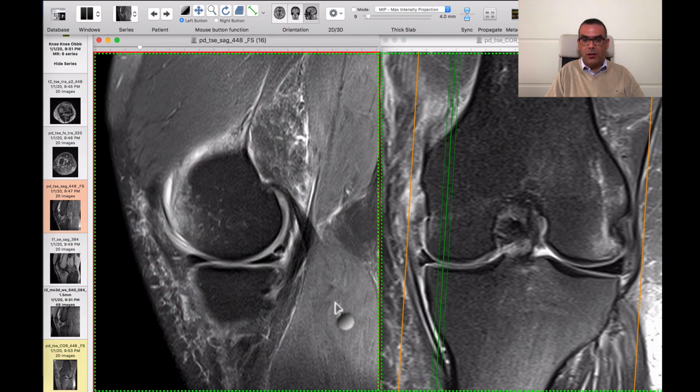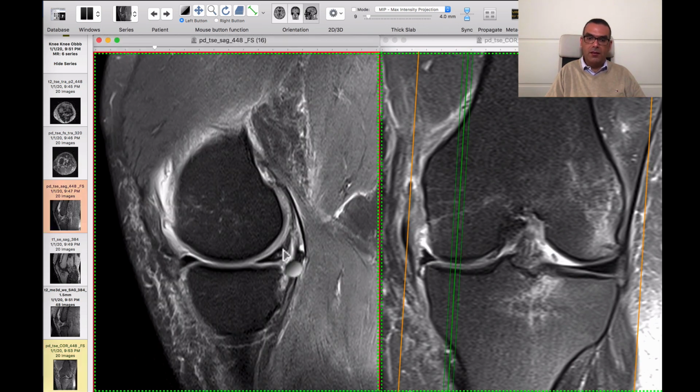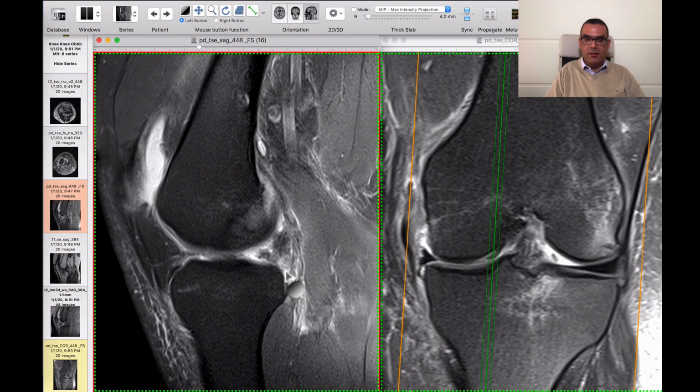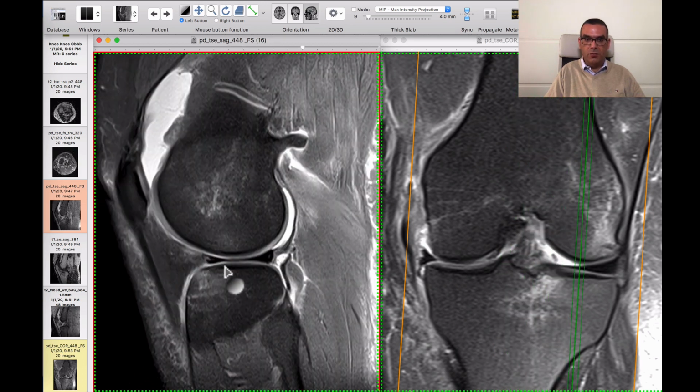You have to take it very slowly. First we identified there is a pathology at this area. This base of the triangle, there is an amputated part of it. We switched to the coronal. We identified there is superior meniscocapsular ligament injury, and this meniscal tear associated with the meniscocapsular injury resulted in this small loose meniscal fragment. So that's the medial meniscus. We can see, of course, the PCL looks good and the ACL also looks good.